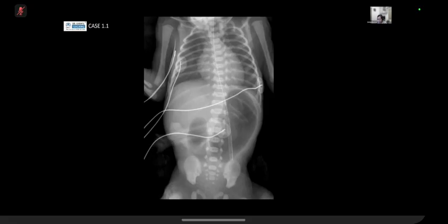It's something that the surgeons wouldn't need you to do an upper GI contrast on, because there is no further gas distally, and essentially what they need to do is to go in and operate. So they're quite happy with this. You don't have to wake up in the night to do an upper GI for this.